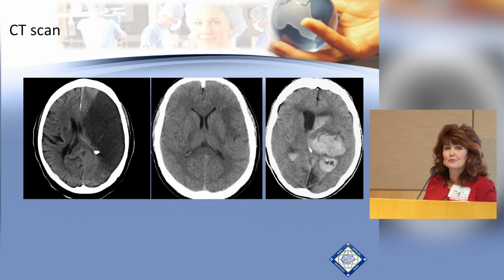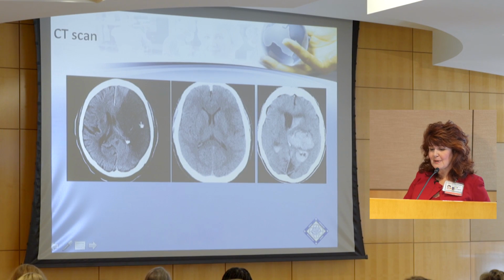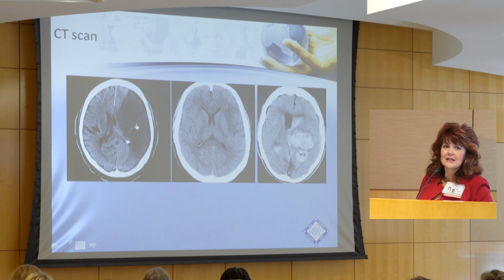So this is an example of what we might find on CT scans. If someone told me the symptoms started 10 minutes ago, and this is my scan, do I believe them? No. That is a large vessel stroke. That is at a minimum the whole MCA, right? And so that's the entire left MCA. That's a dominant hemisphere, and that's a big problem.